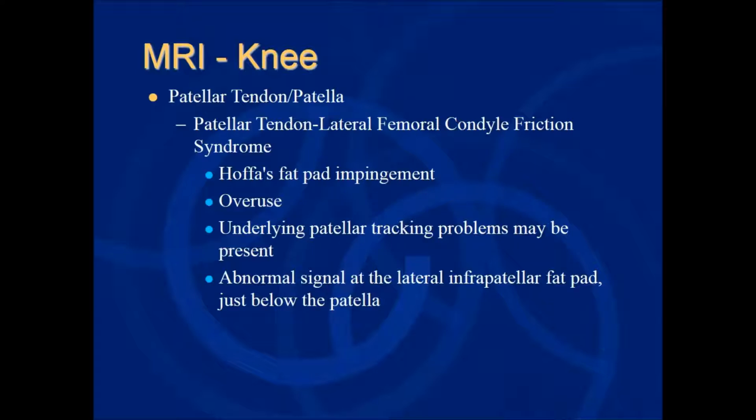Patellar tendon lateral femoral condyle friction syndrome. This is basically when the knee goes from flexion to extension in normal movement, the patella and the patellar tendon are not tracking exactly where they should, and they kind of give rise to an edema. This is an overuse abnormality. You get abnormal signal at the lateral infrapatellar fat pad just below the inferior pole of the patella.